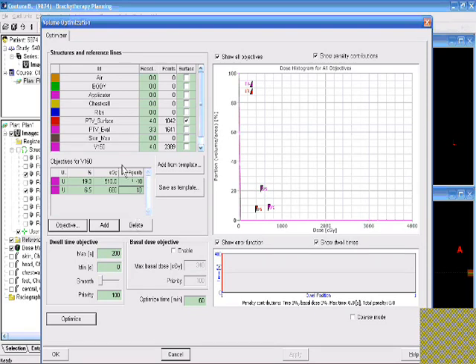We'll put the skin max in again, and we'll have an upper there. And we can leave this at about 5%. And we'll have the dose be actually the treatment dose, because that's where we'd like to hold that. And the other thing I wanted to do with that surface, I wanted to move this volume up to about 30%. Sorry.